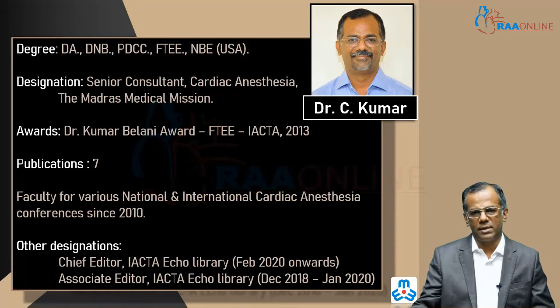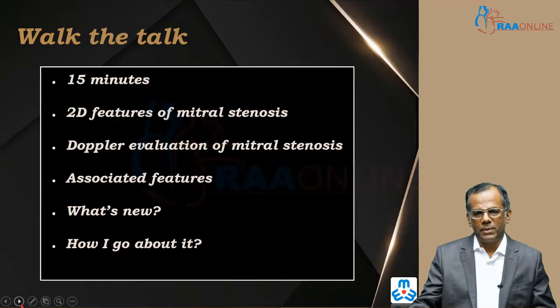Today, I would be talking about 2D analysis and Doppler echocardiography in mitral stenosis. It will be a 15-minute talk. I'll be talking about 2D features of mitral stenosis, the Doppler evaluation of mitral stenosis, the associated features, what's new, and how I usually go about it.